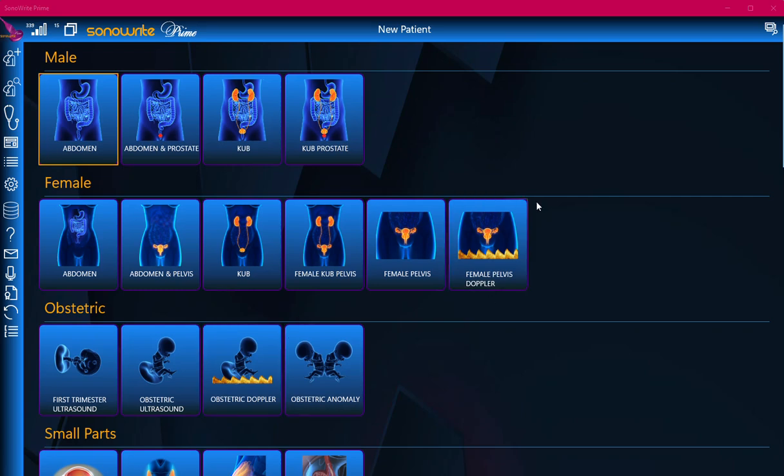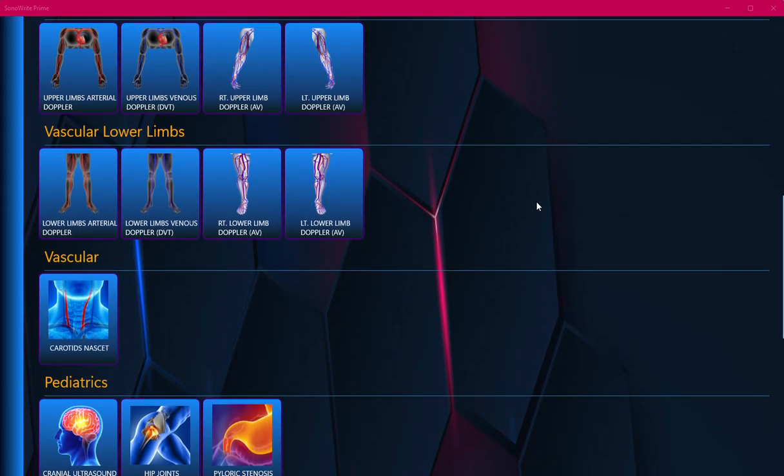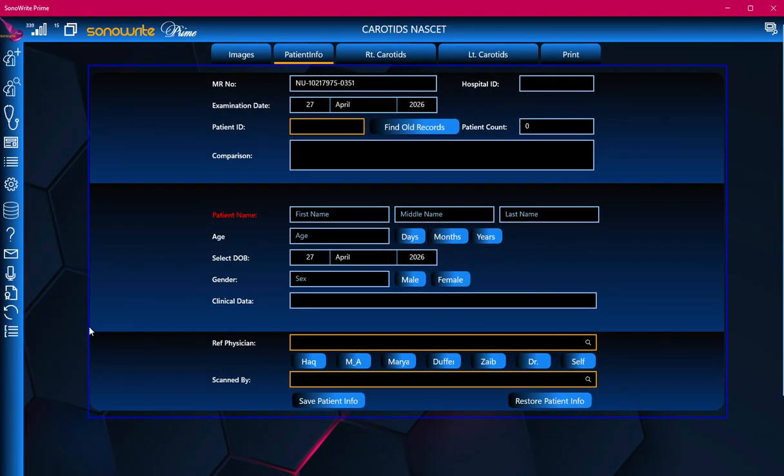Hi fellows! In this video, I will tell you how to write a report for Doppler ultrasound of carotid arteries. By clicking on Carotid Vascular Doppler Study Type, the report designer is opened.